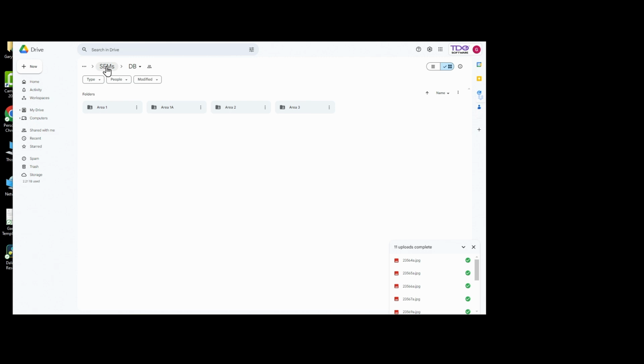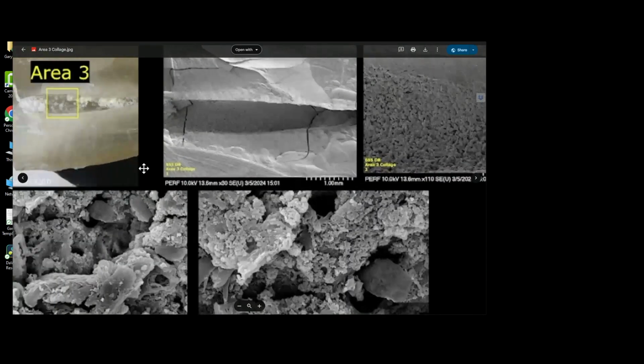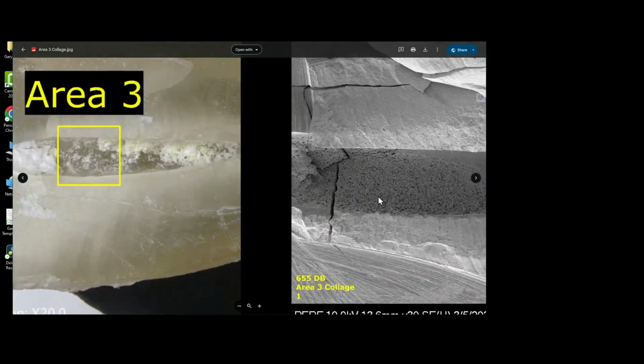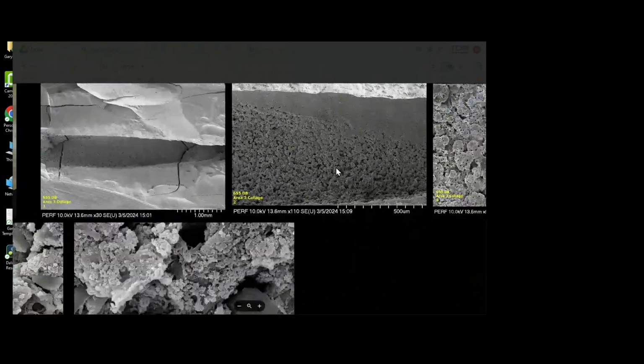And you can see quite a bit of demineralization taking place, but maybe the sodium hypochlorite in New Zealand is different. Here you get kind of a classic sense of the predentin area.